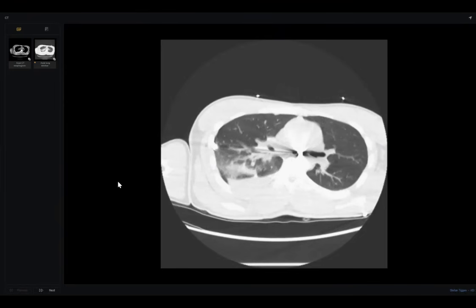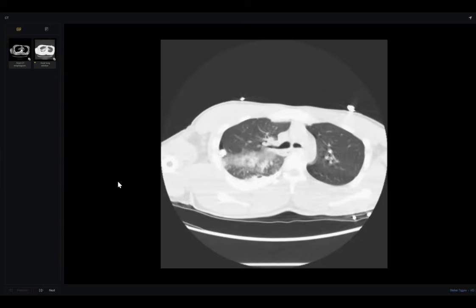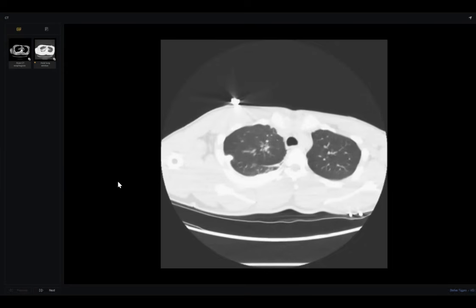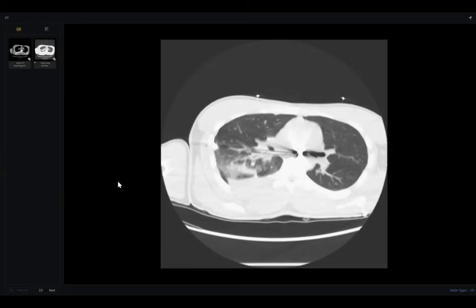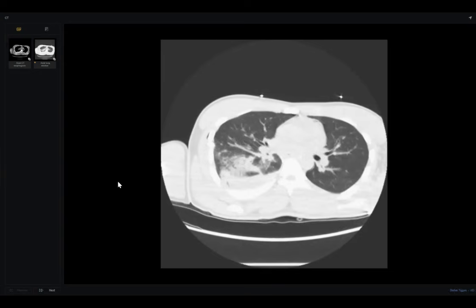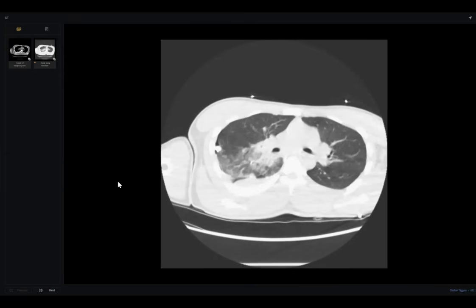A fistulous tract. Why? The course of the bullet. Yes. So give me a final diagnosis. This is a patient post-gunshot with right-sided hemothorax and pneumothorax with chest tube insertion and esophageal tear.